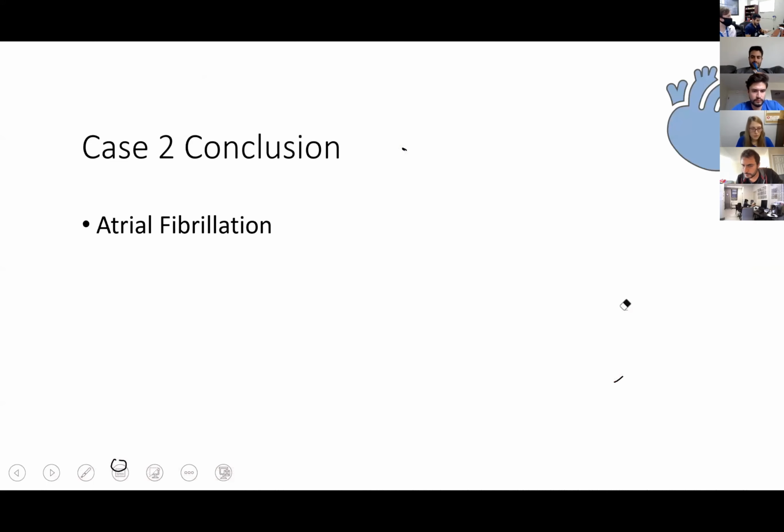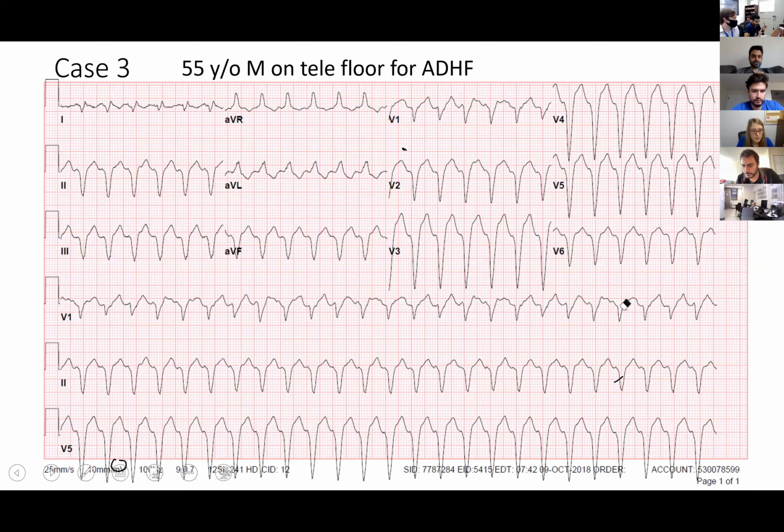Yep. Okay. So AFib, right? Now this one, I'm just going to go through it. I just wanted you to see how differently it looks, something that is completely opposite of normal sinus. Okay, so again, you have a patient with acute decompensated heart failure. In this case, you cannot really assess much more than saying the voltage is well standardized. The T wave is negative in AVR, so you're assuming it's well taken, and then you see how wide complex tachycardia goes. Okay, so this is definitely more than 110 milliseconds, and it is regular.